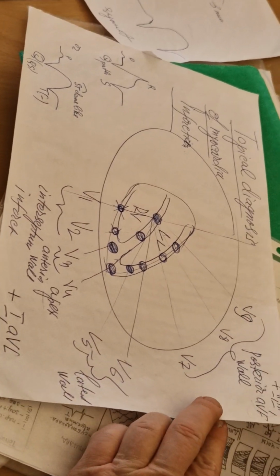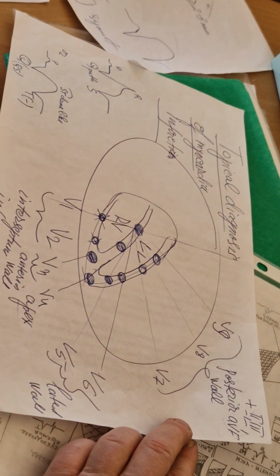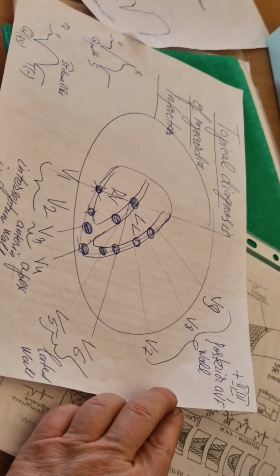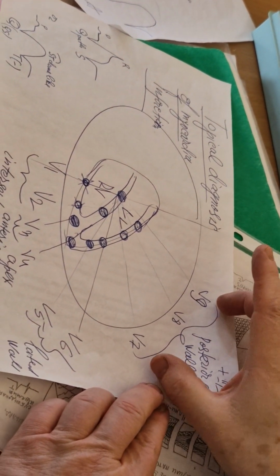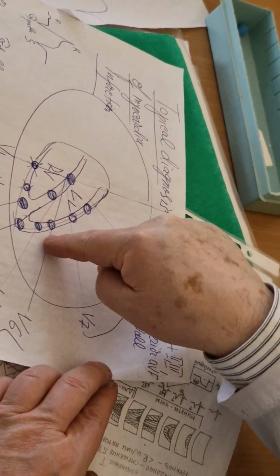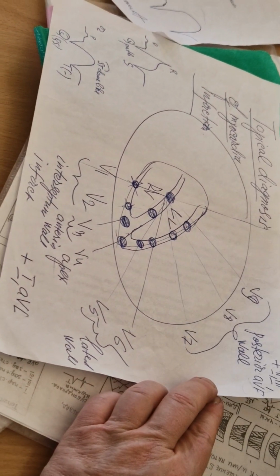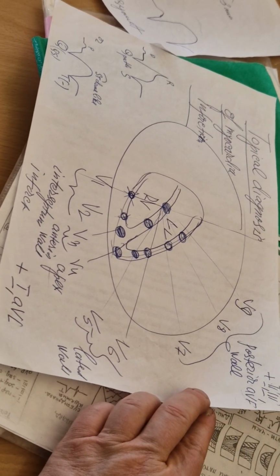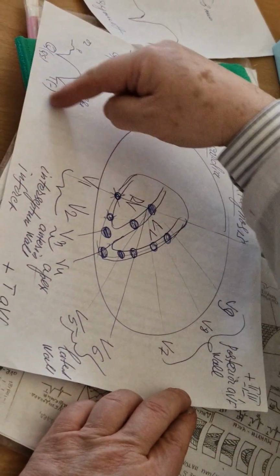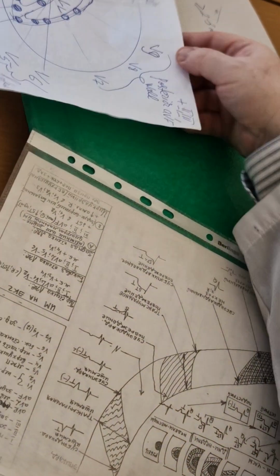Posterior wall: second, third standard, aVF. Or if we have a problem, not clear elevation, in a patient in semi-sitting or sitting position we can check the posterior leads: V7, posterior axillary; V8, scapular; V9, vertebral line. And what are the typical changes in macrofocal infarction?